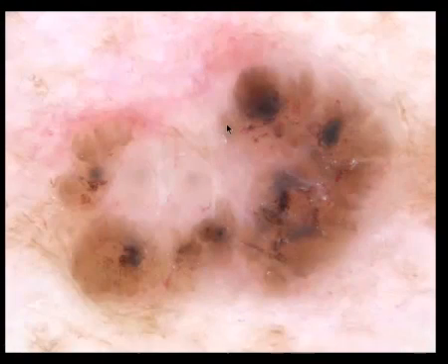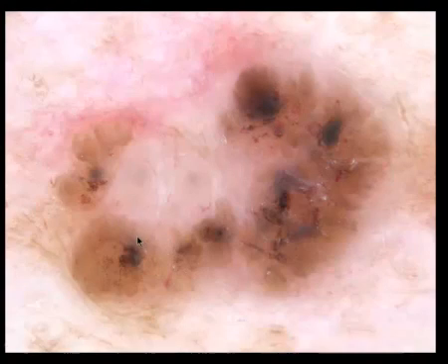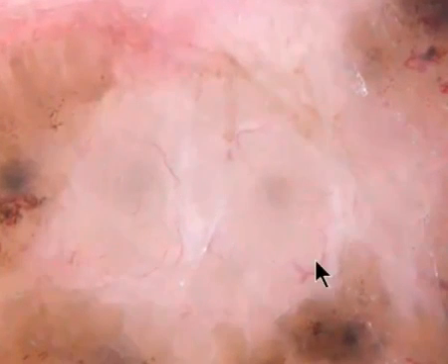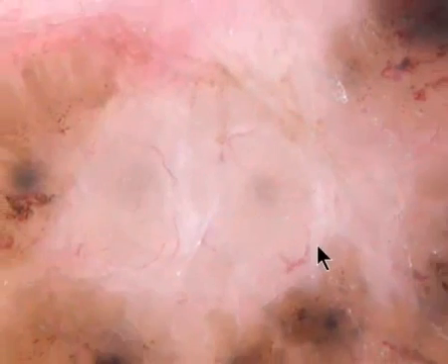Now, this lesion here also has clods. The colors are gray and some are brown, and there's also a structureless zone here. So again, we have to exclude melanoma, basal cell carcinoma. Now, gray clods can be found in both. They're more common in basal cell carcinoma. Now, what about the vessels? You have serpentine vessels, not branching, but serpentine, that's enough.